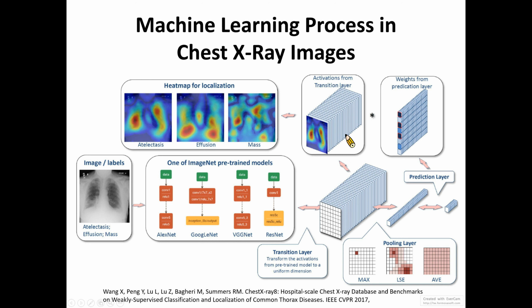So if you just open this coding.txt, you will see that the 0 means non-pneumonia and the 1 represents the cases with pneumonia. When you click into the 0 folder, you will find there are 1,000 DICOM images, which have the extension .dcm, and likewise in folder 1, there are also 1,000 DICOM images with pneumonia.